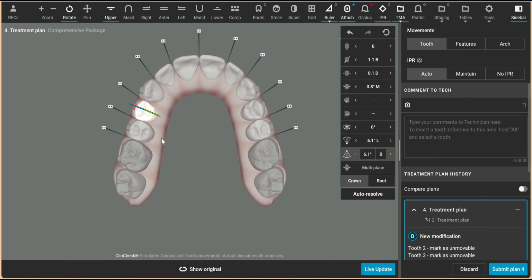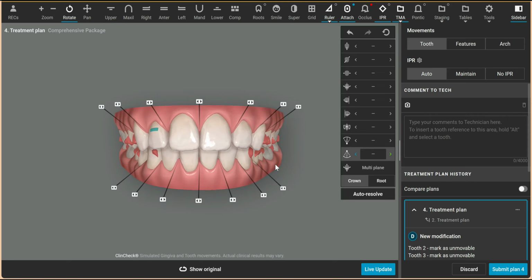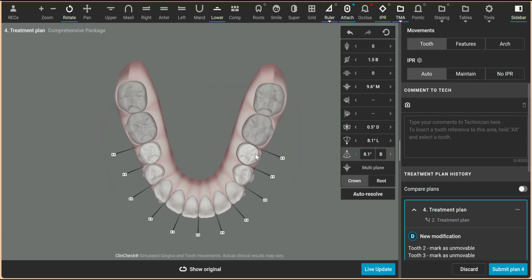So if you try to translate a tooth and move the root apex and the crown out 2 or 3 millimeters of expansion, you're going to procline that tooth. The crown may go out 3 millimeters, but the root apex will lag behind. So this arch form looks good. I just verify that I like it. If you decided that you wanted to bring this out a little more, just go a little bit more. And then you have to go down on the bottom and coordinate the arches.